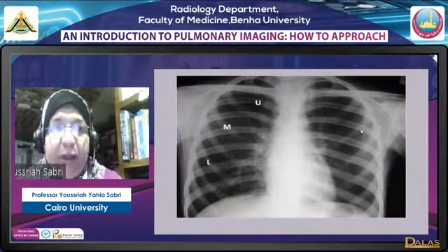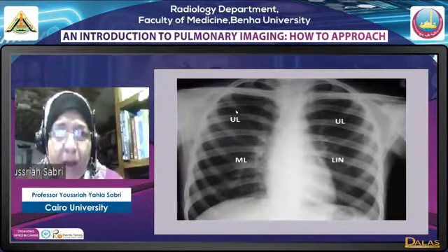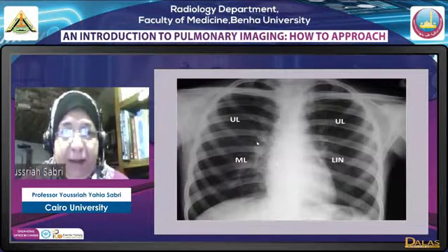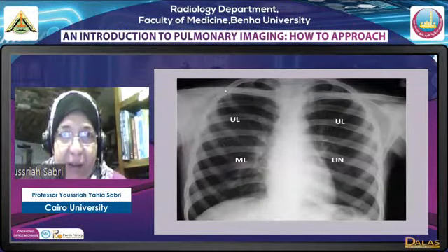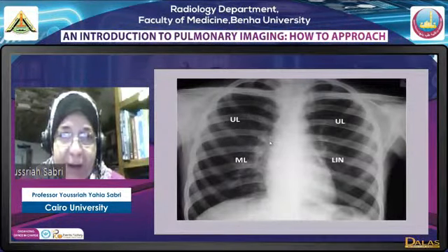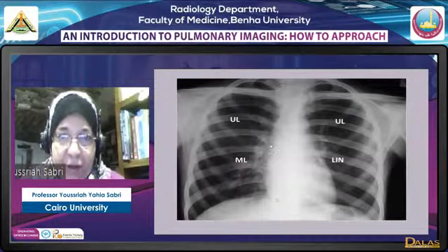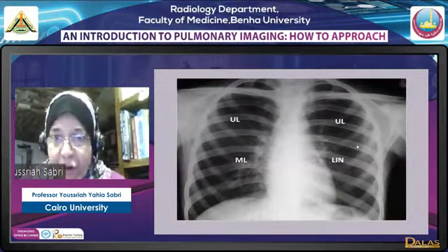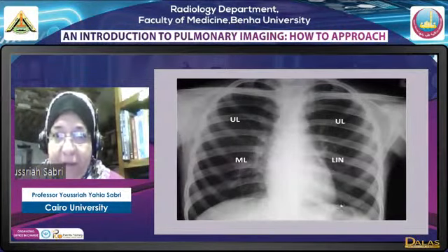There is another way to describe the lungs: lobar. The upper lobes, on both sides. Very simply, this is the hilum, extending a line from the center of the hilum peripherally. What is above this line is a triangle on both sides, representing the upper lobe. From this line, we have another triangle: we join the tip of this line to the cardiophrenic angle, with the cardiac border, giving another triangle. On the right side, this represents the middle lobe, a mirror image of what we have just described. On the left side, we have the upper lobe, and we have the lingula.